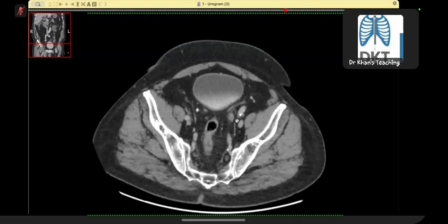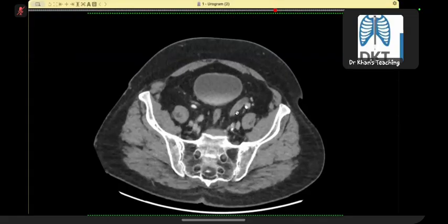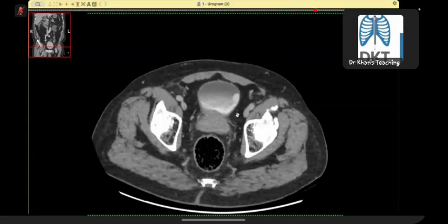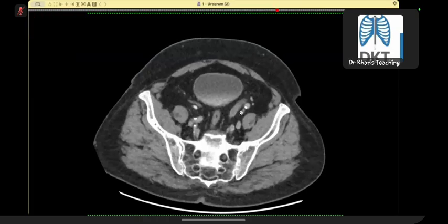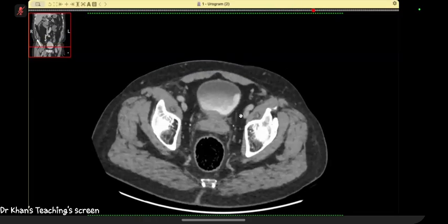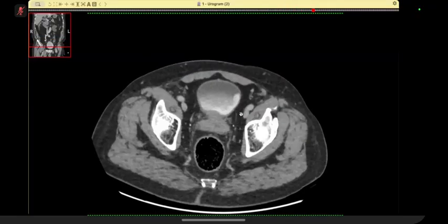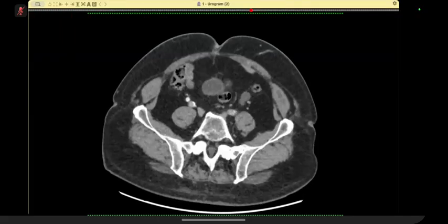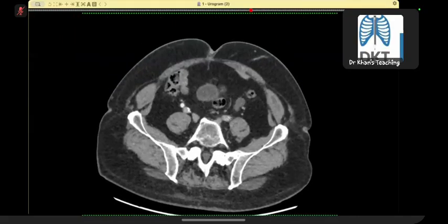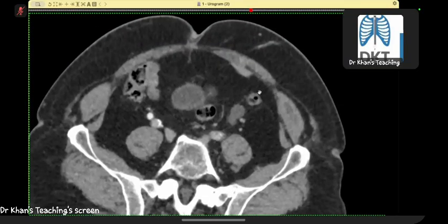You should have asked for a non-contrast scan, or said that in your normal practice you would compare with non-enhanced, just to confirm that this is enhancement, because the other differential diagnosis, such as hematoma, also has to be ruled out.